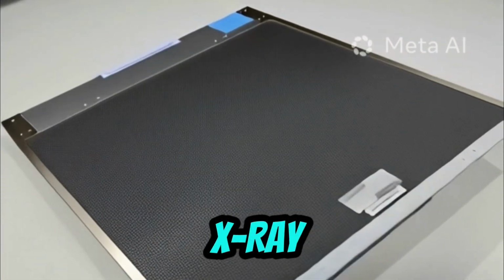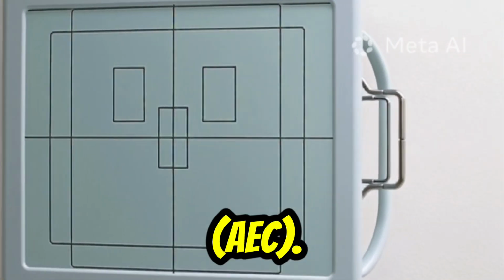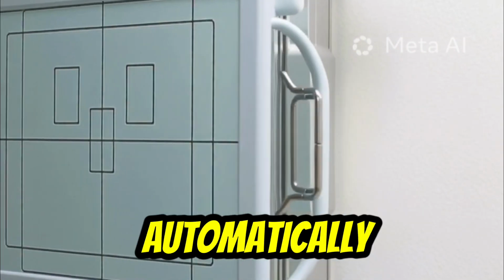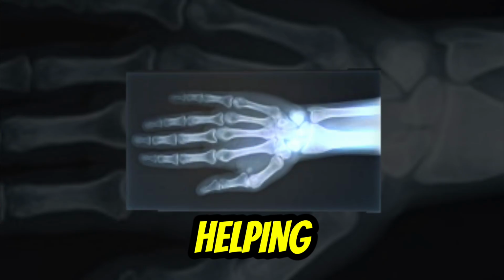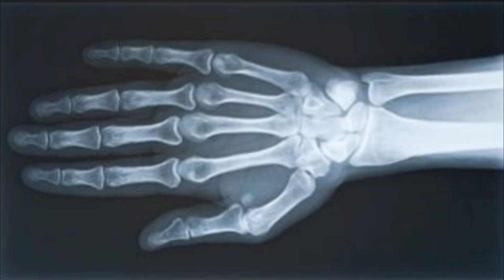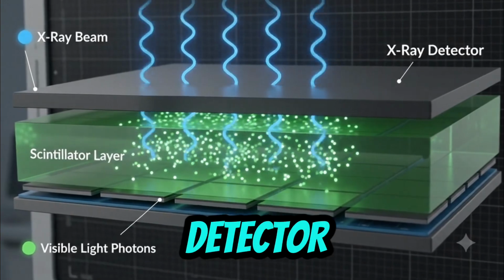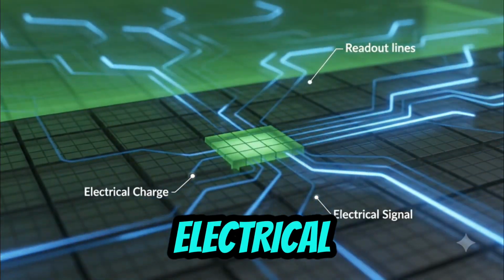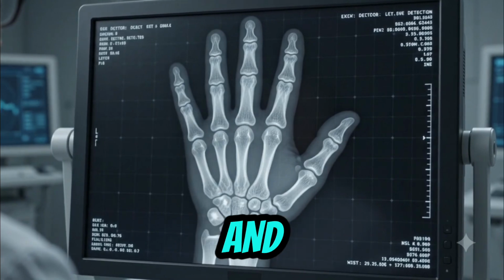Many modern X-ray systems also use automatic exposure control, AEC. This feature automatically terminates the exposure when sufficient radiation reaches the detector, helping maintain consistent image quality while minimizing patient dose. The transmitted X-rays are captured by a digital detector. The detector converts the X-rays into electrical signals, which are processed to produce a digital image for viewing and diagnosis.